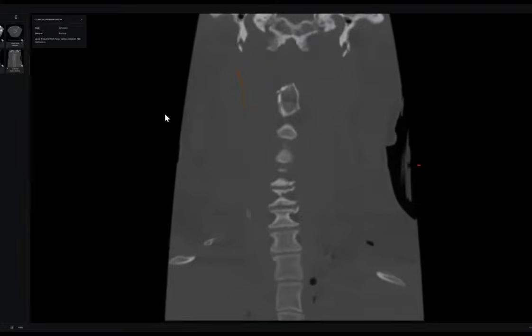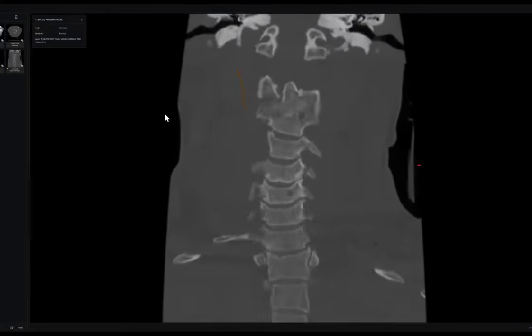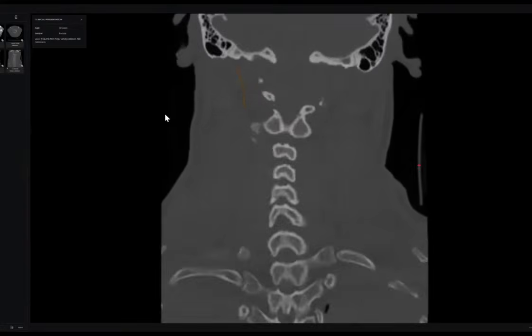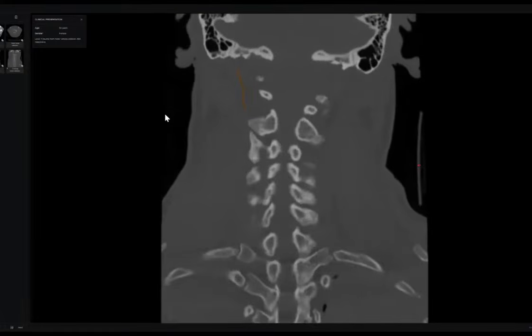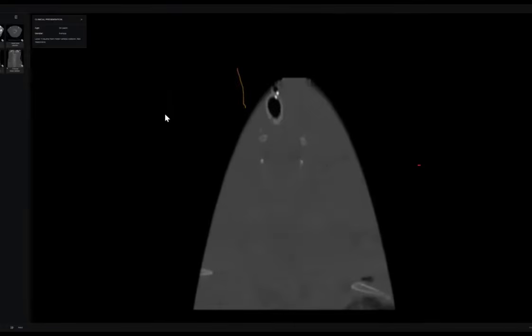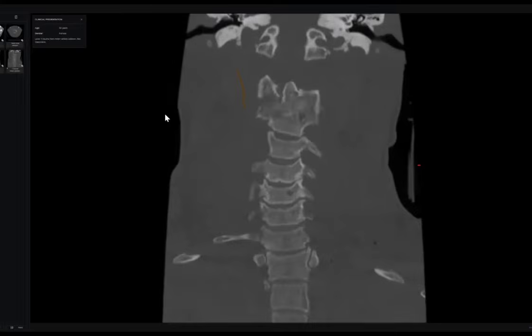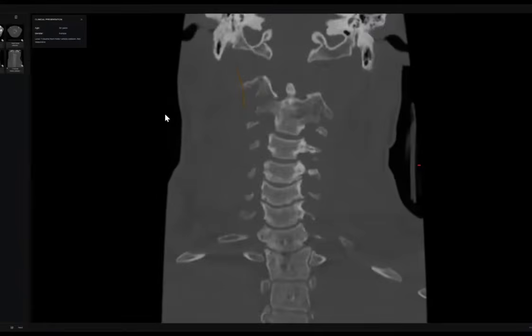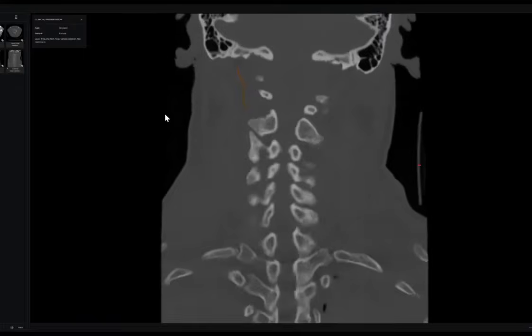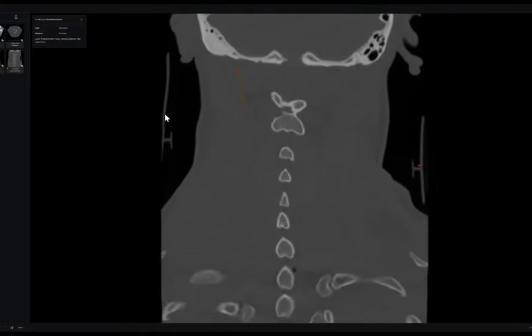This is a life-saving case. It needs meticulous research about everything. This patient should also go for MRI and a skeletal survey, because if you have a look here, you will find some rib fractures. Any polytrauma patient must undergo a skeletal survey X-ray, especially if he has major trauma like this.